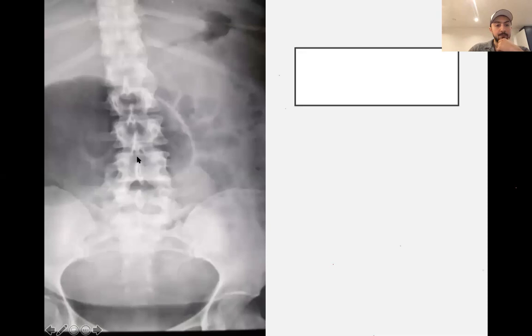That one, go on. That one is, again, also a volvulus, but it's a cecal volvulus, not a sigmoid volvulus, because you can have a volvulus in the cecum, as you know, the beginning of the colon. But usually it happens in the sigmoid.